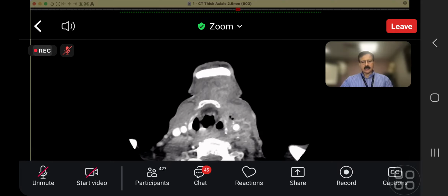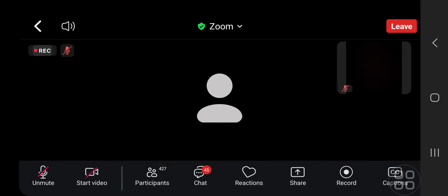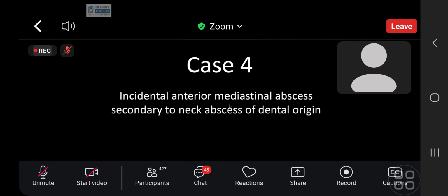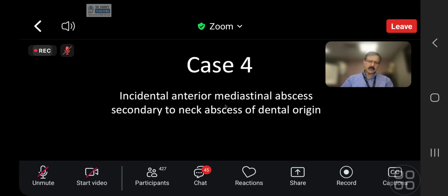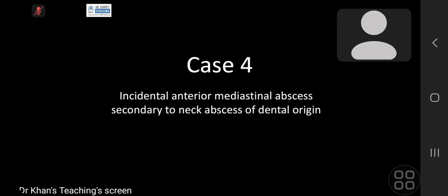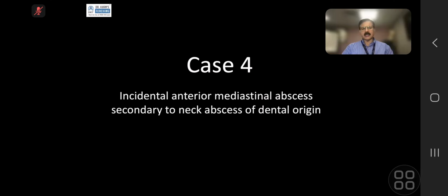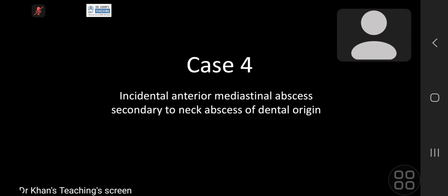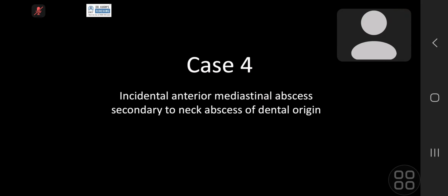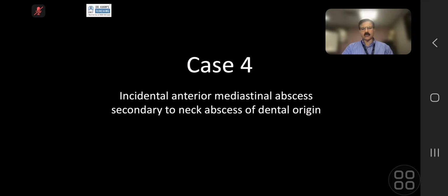Okay, thank you. I'll take over. Very, very interesting case. It is hot off the press. Last week we saw it. As you picked up very well, an incidental anterior mediastinal abscess, and clinically, nobody was suspecting it. But the key thing is that this abscess was coming from upstairs, as in the neck. And that was the key. One has to think what is happening.